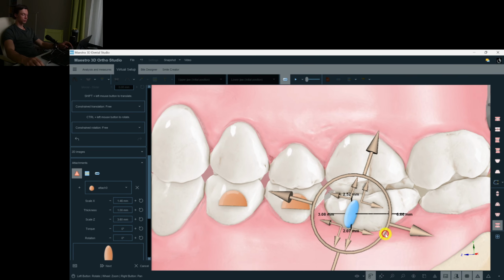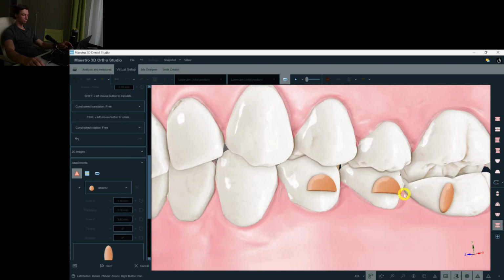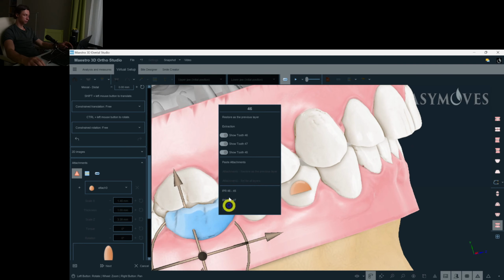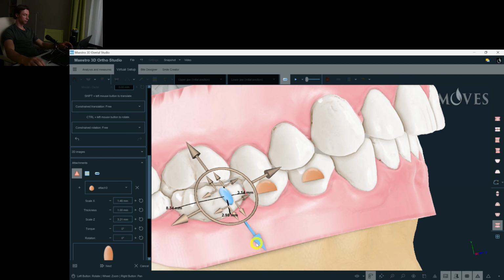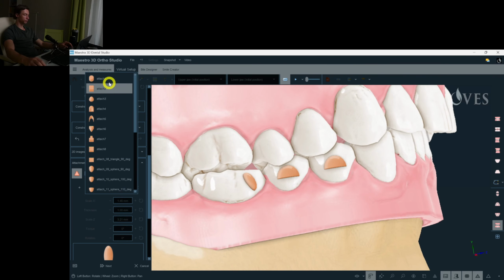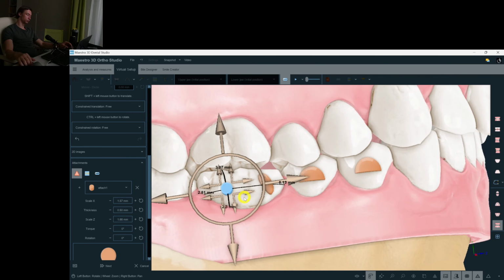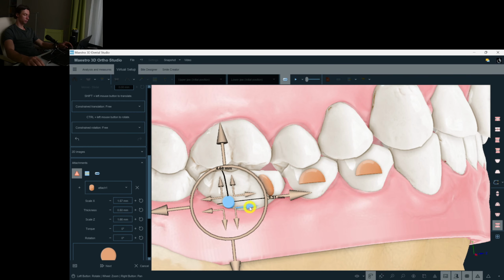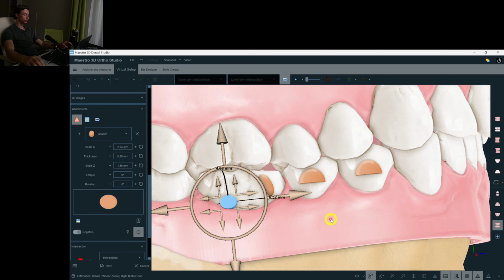I'm going to use this shape number 3, the elliptical one, to protect the molars from unwanted tipping and extrusion. But if it extrudes, it's not gonna be a bad thing for us. We'll raise the bite, which is not bad at all.